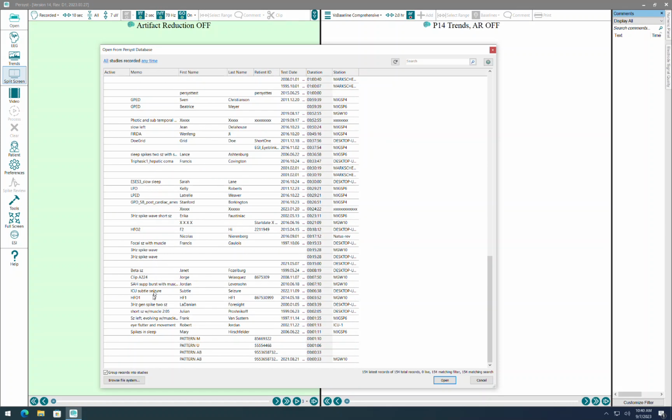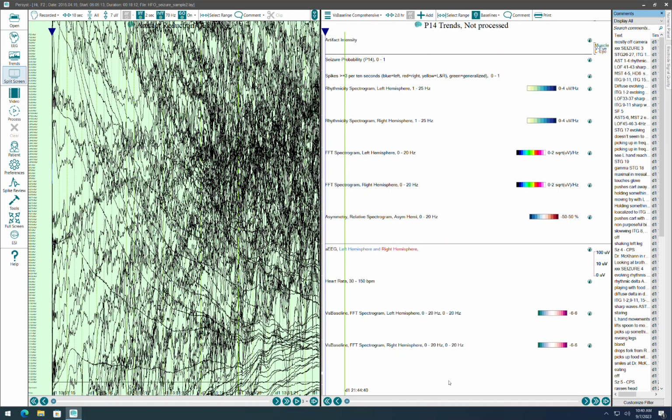And again, this process that we're going to be going through just goes through processing a recording in Persyst offline. This happens to be in Persyst layout format. If you're doing this within an OEM EEG system, some of the instructions may be specific to that as far as how Persyst is integrated. And if you're doing it online, of course, that is definitely dependent on several things within the OEM integration that can vary from system to system. So in those cases, let's go ahead and web conference and go through some of those specifics for that. But in this case, we're just going to be looking at a recording offline.